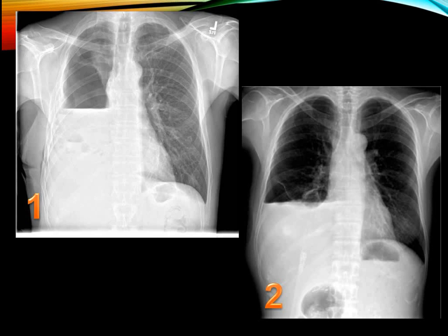Chest x-ray number 1 and 2 both are example of hydropneumothorax. نلاحظ في الفيلمين وجود very big air fluid level يمتد من منطقة الهايلم تقريبا إلى اللاترال chest wall، ويفصل big opacity below it اللي هي الفلويد عن translucency above it اللي هي الاير والبقايا من الاريتد lung.